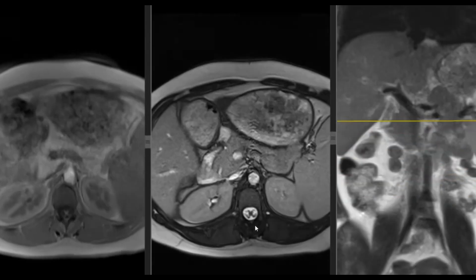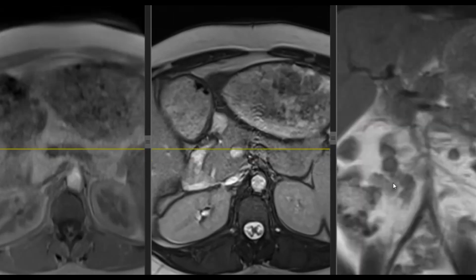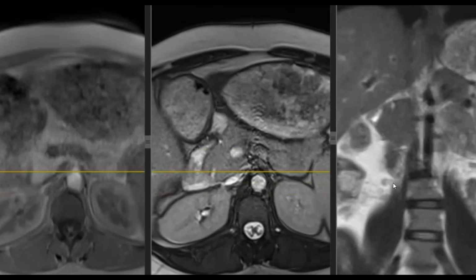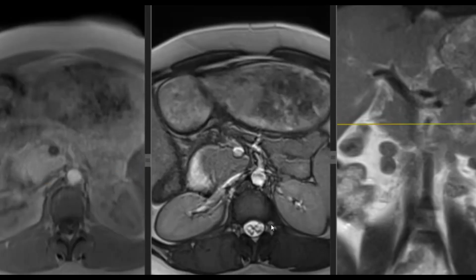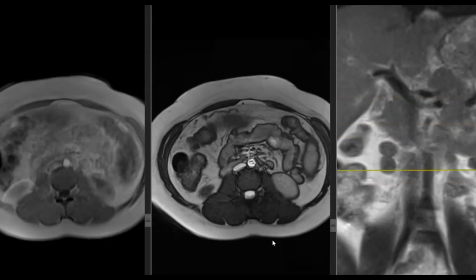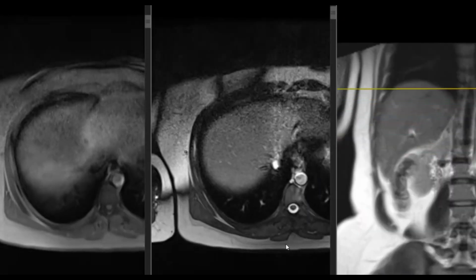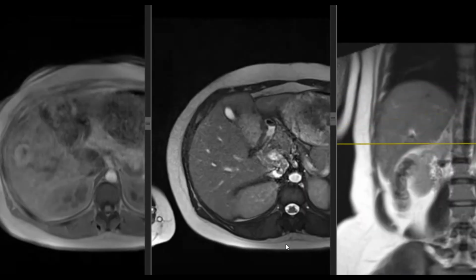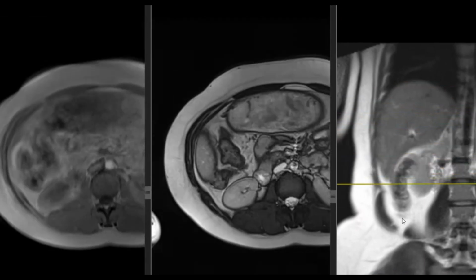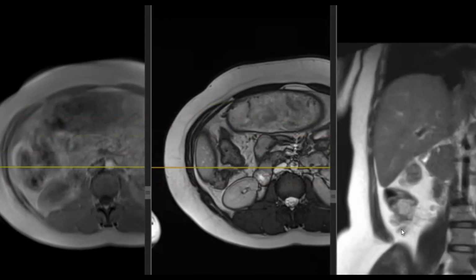What do you see? This is the head of the pancreas. Is it normal or abnormal? Normal. I totally agree. So we have summarized your findings: distended stomach, but otherwise normal. I want to see the liver. Magnifying on the liver. Well, nothing really significant. Me too, I don't think anything significant.